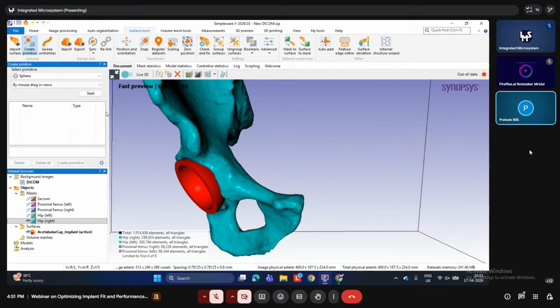A primitive is basically used when we are working on a specific data set and we want some specific part, or the operation on that specific part, to be more efficient. That is how primitives are used.